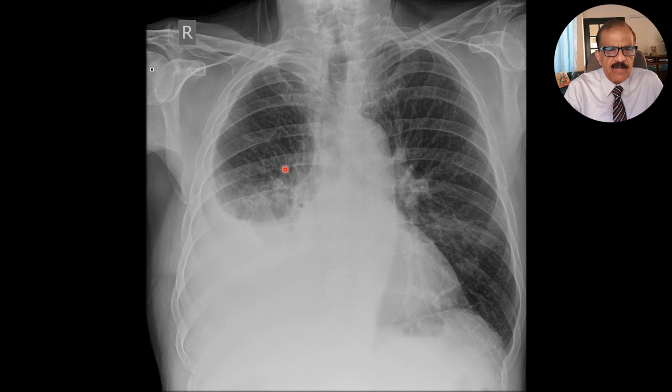Lung has collapsed toward the normal hilum side. So there is an opacity. This opacity is homogeneous, and it is obliterating the right cardiophrenic angle, right costophrenic angle, diaphragm, and the right cardiac border. So all are not visible because this opacity is so dense, it has merged into the neighboring structures' shadows.